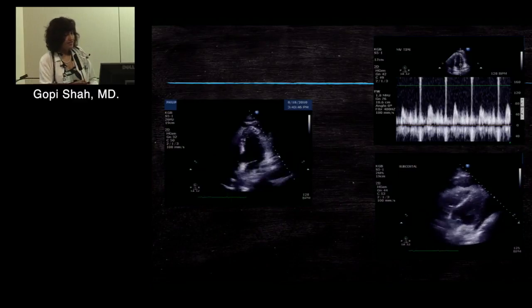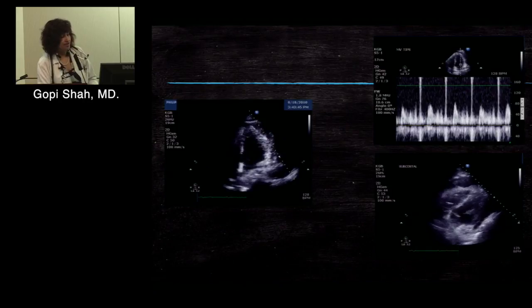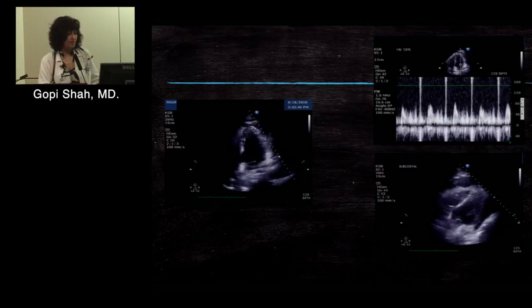Importantly, you're not seeing a whole lot of variation here. Again, we don't have a respirometer. You don't have enough sampling. So this is not, again, well done from a Doppler standpoint.